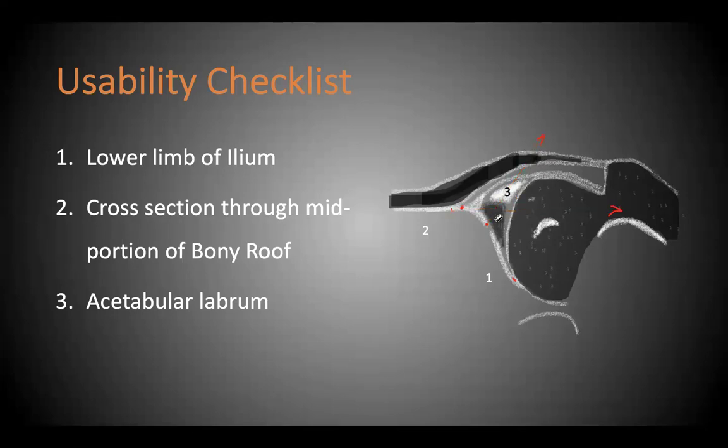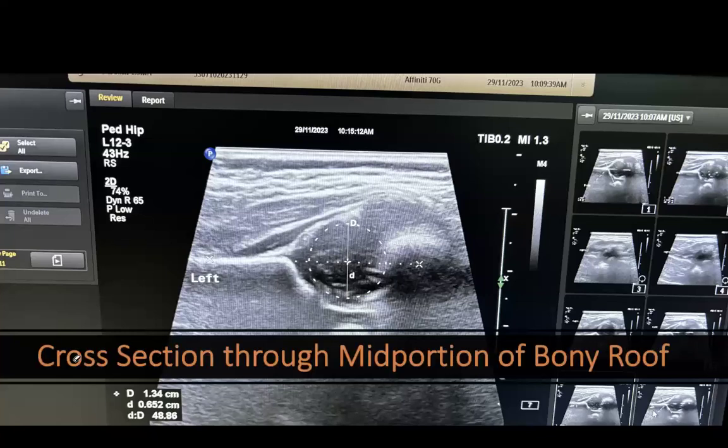Okay. So here again, we'll start tracing from the medial side, lower medial to proximal lateral. And we are going to go from concavity to convexity. So the junction where the concavity is turning into convexity would be your turning point. So this section here is concave, concave, concave, and now this has started to turn convex. Do you agree? So this point is your turning point.